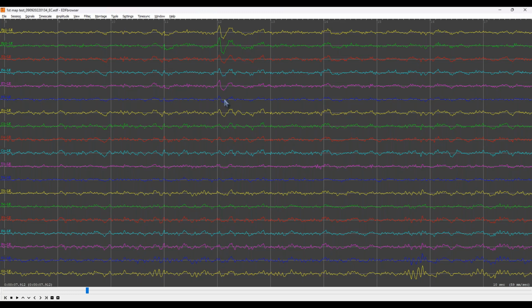So you look at enough of these and you can say, yeah, this is a normal signal versus, yeah, that's abnormal. Like what we see here, these peaks and then the valley, and then it kind of stabilizes, we know this is all artifact. It's just cascading through the whole frontal section of the brain. As we move more posterior through central, temporal, parietals, it dissipates and we really don't see it. So we know this is probably an eye blink.